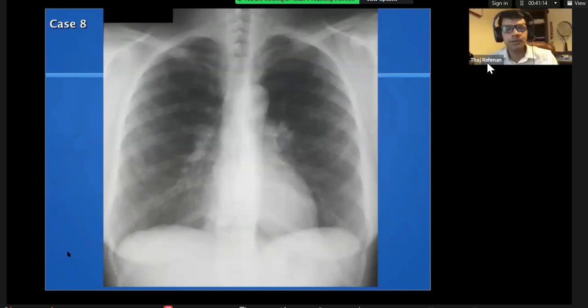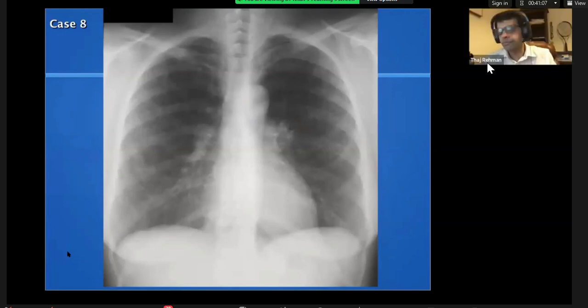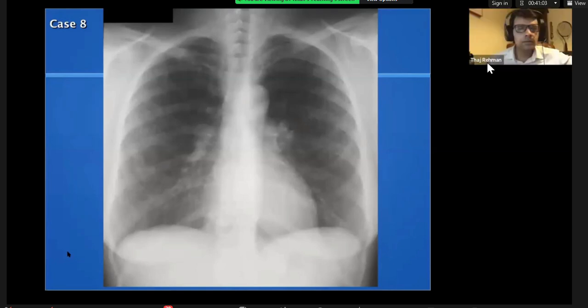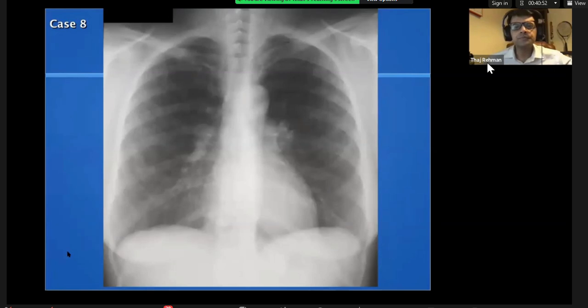Brilliant. So is that number 5? Yeah, your X-ray is ready for you. Okay, so frontal chest X-ray, I can see some emphysematous changes in the upper zones. The lung volumes are largely maintained. No focal lung lesions, no pleural effusions. The pattern of upper zone emphysema changes, I would be thinking along background emphysema, COPD.